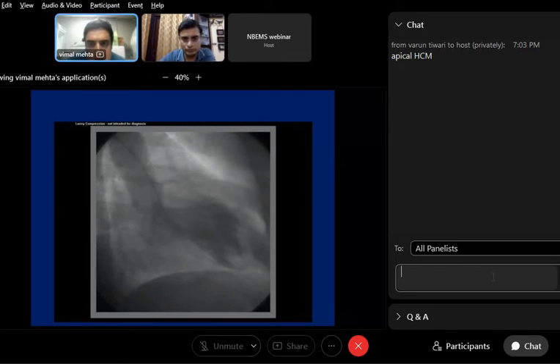Number one, though the angiogram is not that long. But second, I want to know whether this thrombus is new or old. Whether it has been recently formed or it has been there, because you will find thrombi in an old MI patient, they are part of their lives.